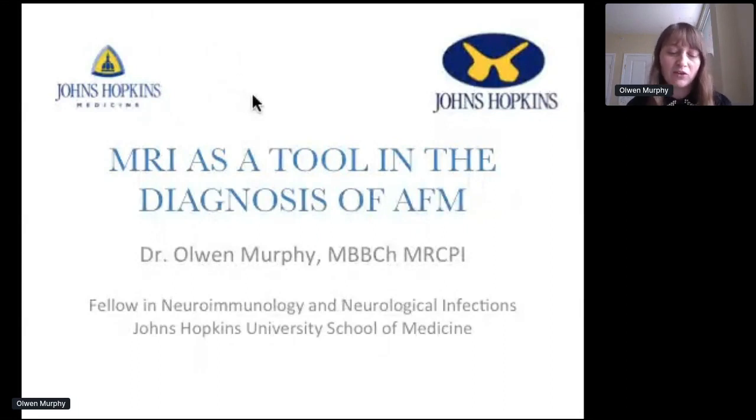What I want to focus on is quite specific. I want to review how clinicians can use MRI in the diagnosis of AFM. And I'm going to do that by reviewing the characteristic and non-characteristic imaging features that can be seen on MRI spine in these patients.